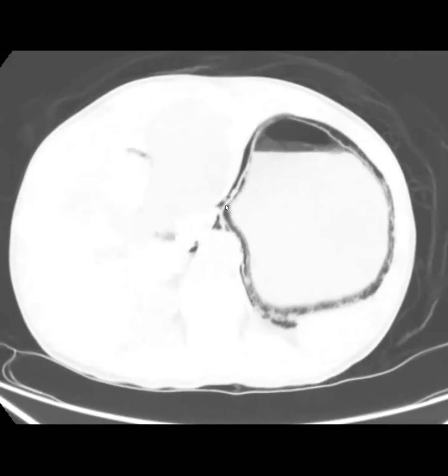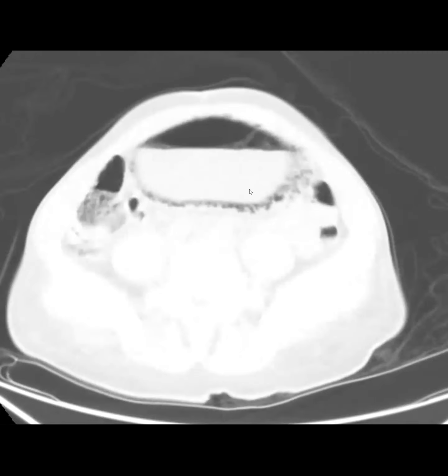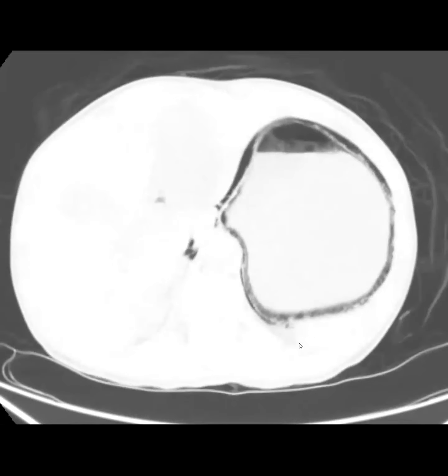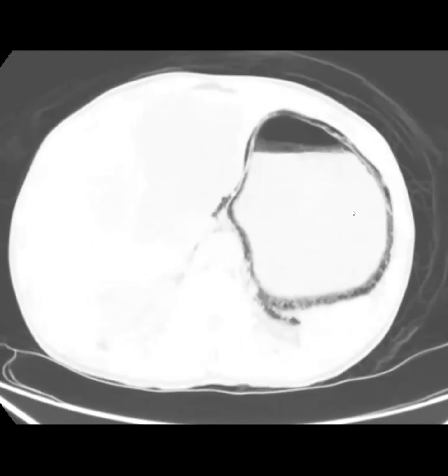And when we talk about gastric pneumatosis, people talk about it in a slightly different way, and they often call it gastric emphysema. There are a couple of different causes. You can have emphysematous gastritis, which is usually a gas-forming organism in the wall, very morbid. And then you can have ischemic pneumatosis, the same thing we talk about in the bowel. And then you can just have gastric emphysema, which is actually the most common cause.